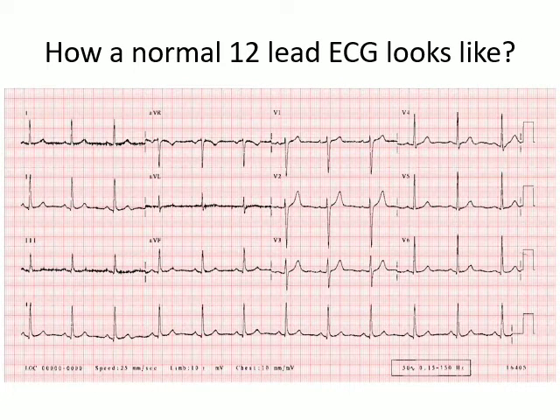Then if you were to look at RR intervals, that is for rhythm, let's say this is one RR interval, this is another, this is again an RR interval, and this is too. So we have marked the successive RR intervals, and we can pretty much say that these RR intervals are not changing, they look pretty much the same. So the rhythm is regular.